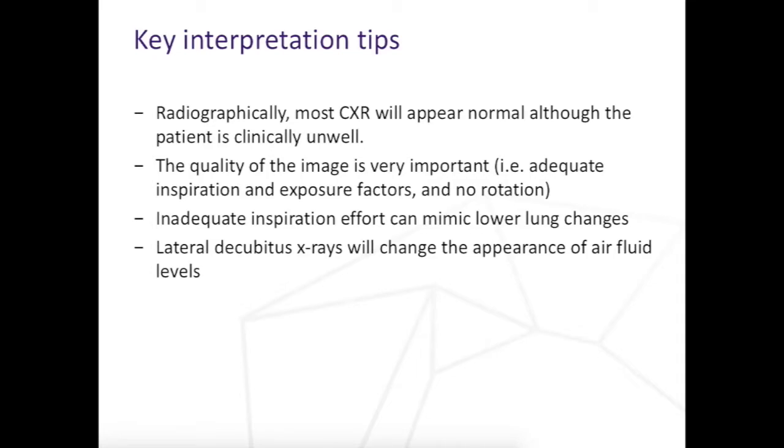The quality of the x-ray is very, very important. You can deceive people and you can deceive yourself if you present a chest x-ray that is abnormal when in fact it's actually due to the image quality. So your density, contrast, rotation, tilt, etc. isn't very good. Just make sure that before you send off a picture, you haven't produced an image that is suboptimal to begin with, which can mimic pathology.